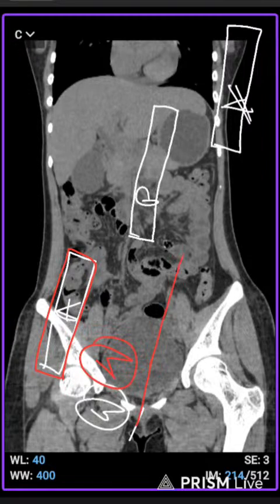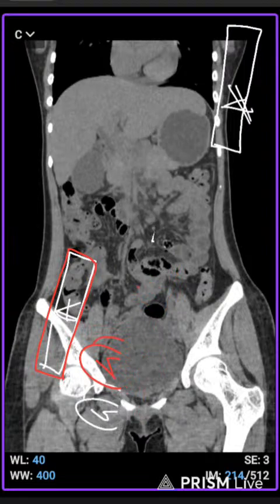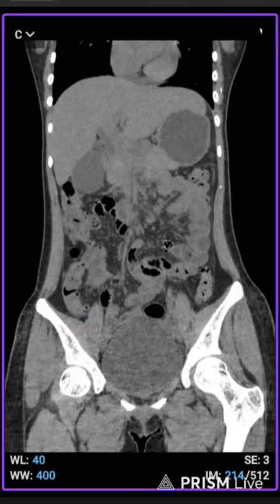After that the next scan is within 14 seconds, or the normal ratio that is the default plan in your system. You should not edit it. Don't worry about the timing of a triphasic abdomen. You just keep whatever is default.